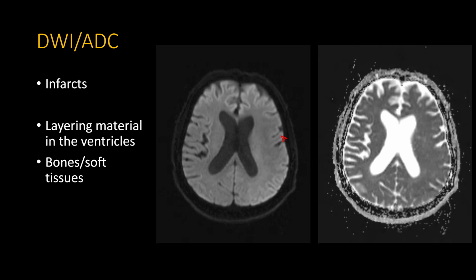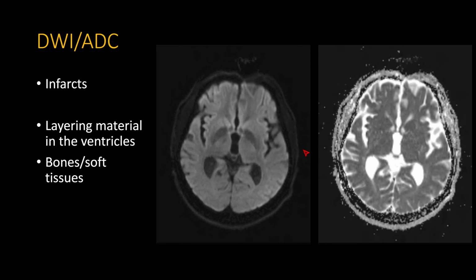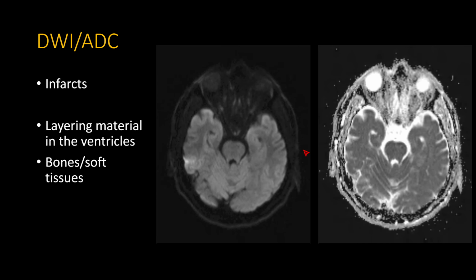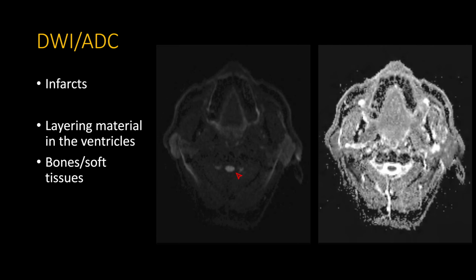The nice thing is, true infarcts are going to be pretty bright and almost light bulb-like. So they're pretty easy to detect as long as you just spend the time on each slice and don't try to rush. Again, you look everywhere, you look at your posterior fossa, etc., and reach all the way to the bottom, the bottommost image you have.